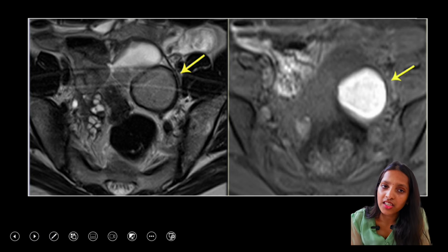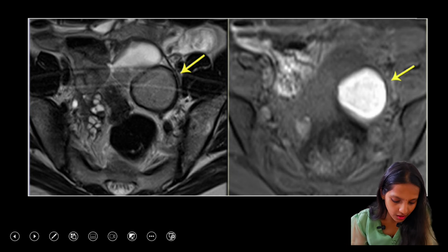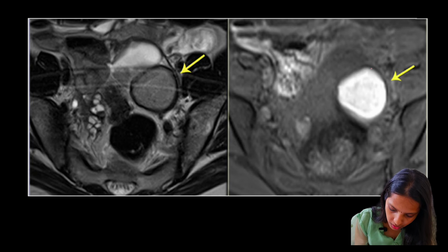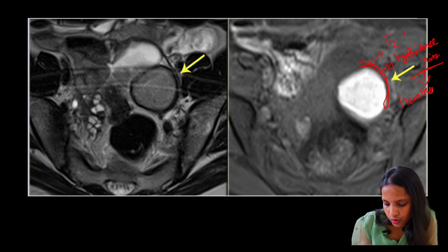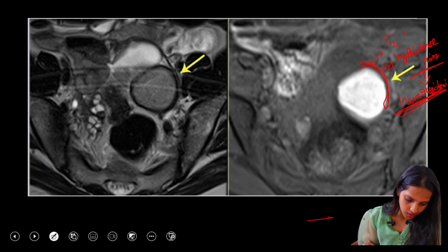Every endometrioma is very well encapsulated, so we can even identify the capsule on the MRI section. In the T2 image, the capsule shows as a black, hypointense rim. The capsule is hypointense because of the deposition of hemosiderin.